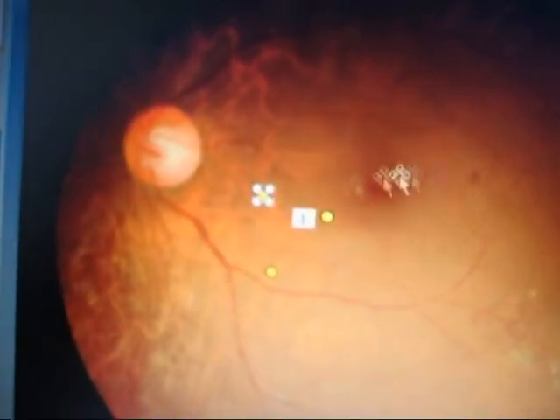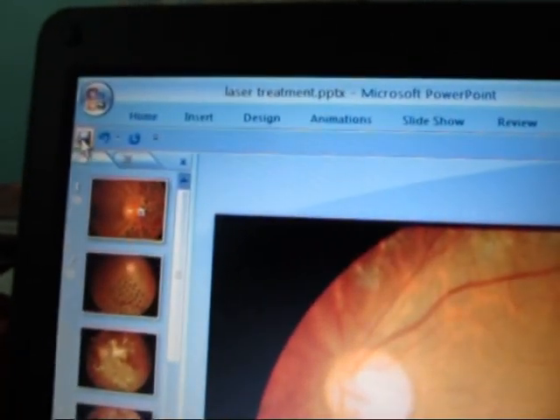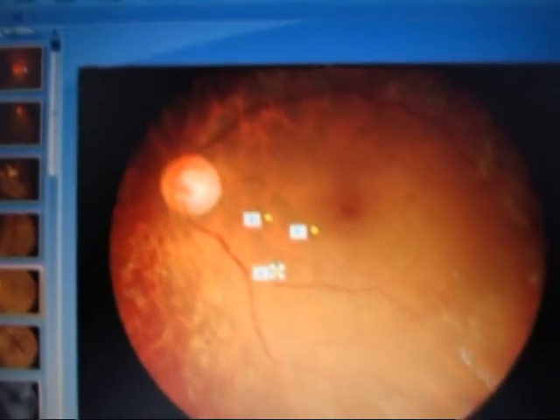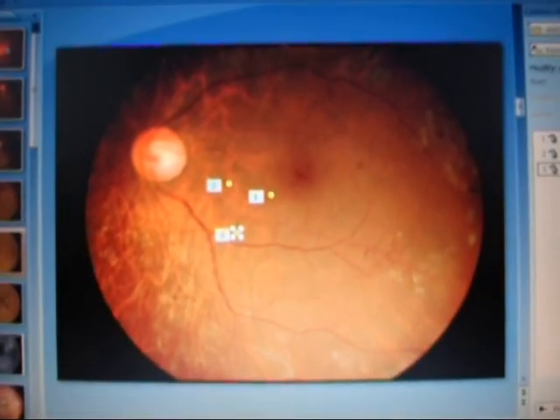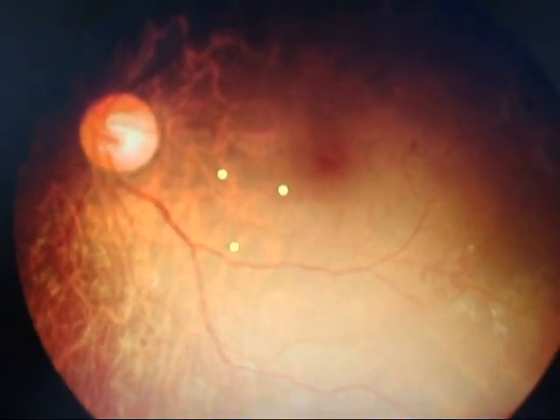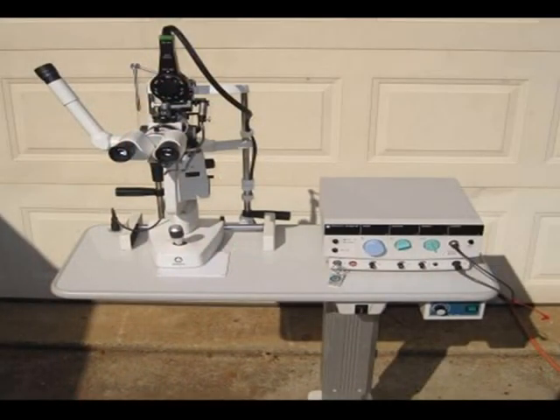It is a useful review tool and also a good source of simulated laser delivery that may be practiced over the computer screen on an actual fundus photograph before laser delivery to the patient. The only currently available teaching tool employs a monocular assistant observation tube connected to a beam splitter on the slit lamp, and even this is not universally available.